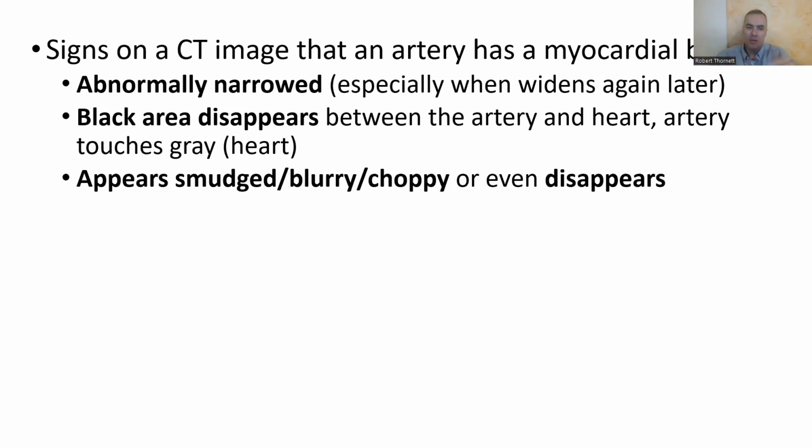If you see two or three of those, and they're very pronounced and you can definitely see them, there's a good chance it's a myocardial bridge. They can sometimes be deceiving, but if you see all of them and they're all there, then it's a very good chance that what you're seeing is your myocardial bridge. Now that we've been through this, you can see that it's not rocket science.